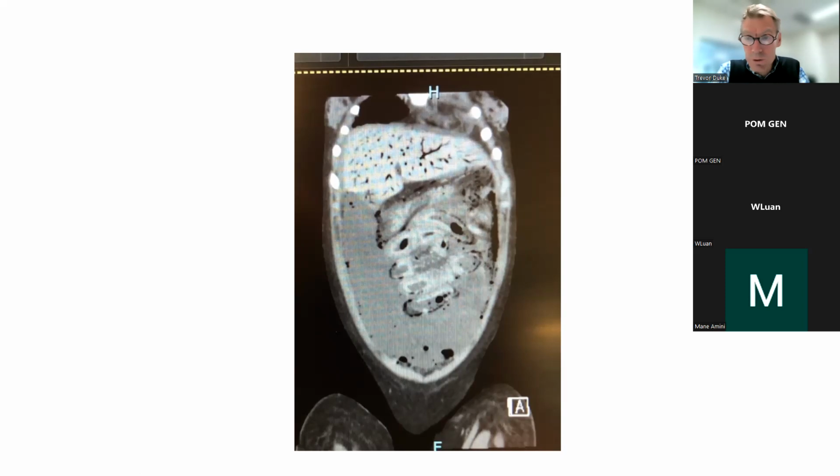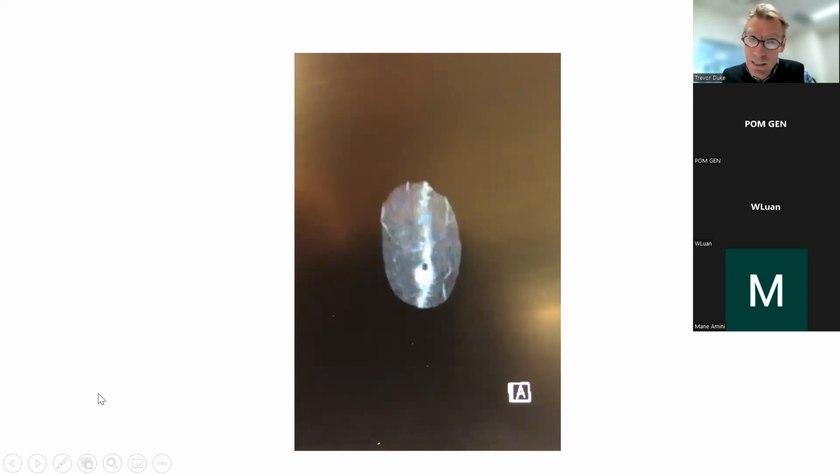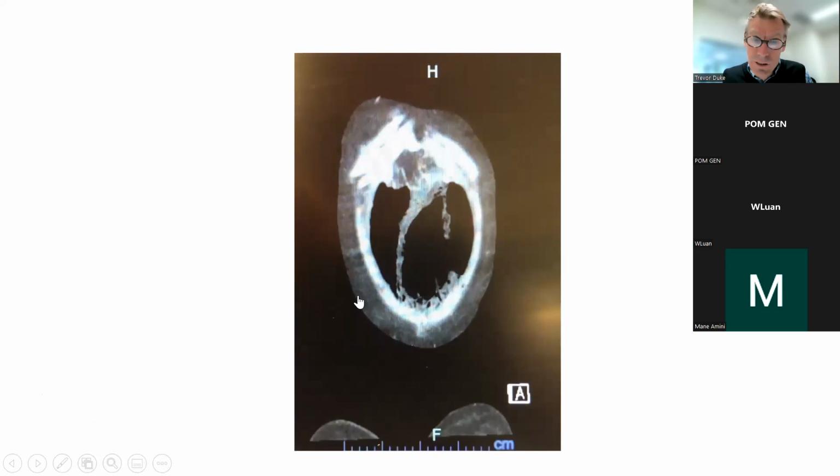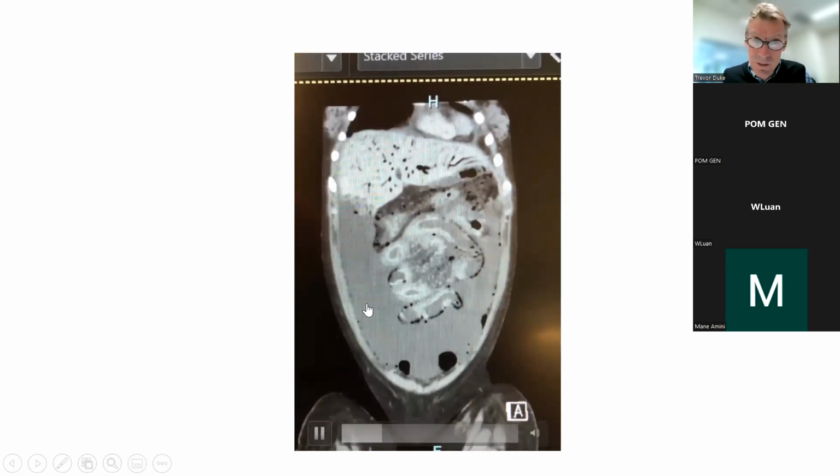found on blood cultures, but also found on the fluid from the peritoneal cavity. And this is what you get when you've got a very bad case of pig bell. Sometimes it's only mild and there's not too much pneumatosis, but this was Clostridium perfringens sepsis in a severe way, and you can get extensive pneumatosis, and you can get gas within the liver.